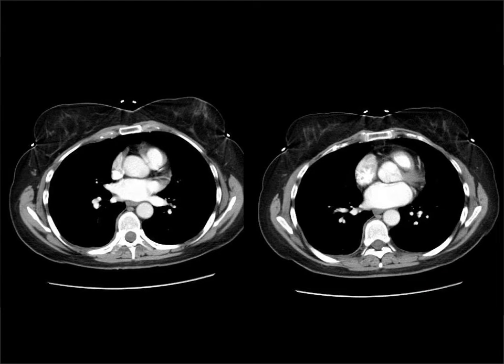Here's an axial image of the left atrium, sitting back here. Remember I said it was the most posterior and the most superior of the chambers. So here's the left atrium, here's the ascending aorta, and this is just a little bit of the pulmonary artery, or the pulmonary outflow tract here, and that's the descending aorta. So it's posterior, and it lies against this structure here, which is the esophagus. So it's immediately anterior to the esophagus, and that will become important in a minute.